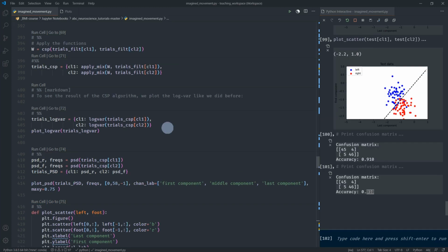This tutorial should be useful to get started with your BCI dataset acquired from a Motor-Imagery experiment. CSP, the common spatial pattern algorithm, is one of the very popular, celebrated algorithms in the Motor-Imagery BCI field. We have seen how we can apply this CSP algorithm today, which requires calculating the covariance matrices, log variance, and other necessary steps. We also used linear discriminant analysis, another commonly used classifier for Motor-Imagery tasks. I hope it was useful. Let me know if you have any questions.